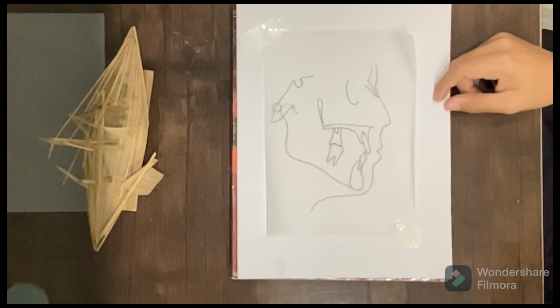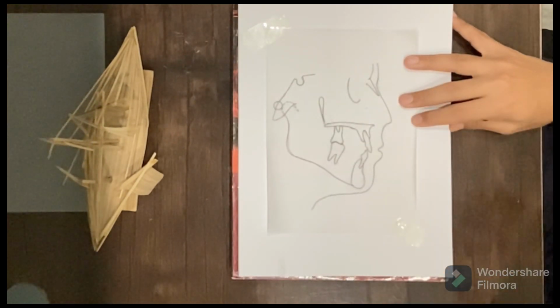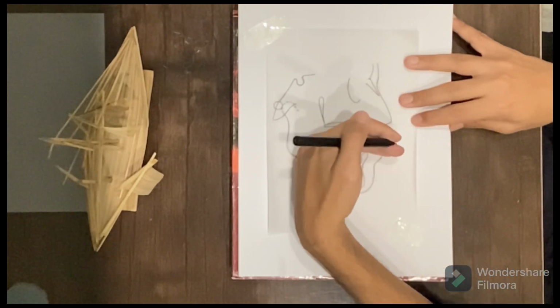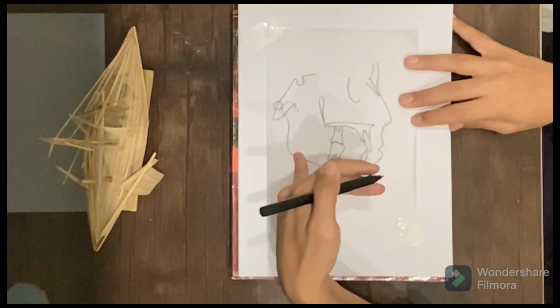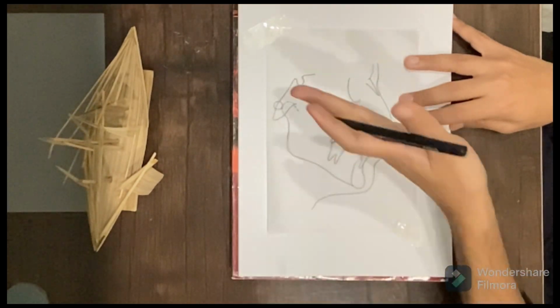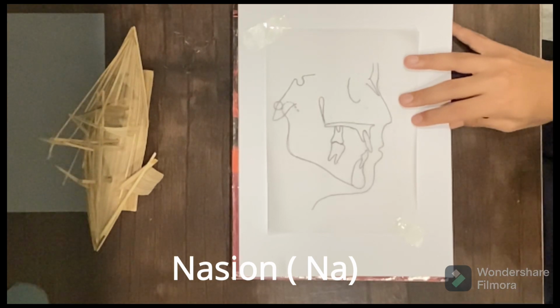Okay, and now about the basic landmarks. Shall we start now? Basically, they are divided into three parts: the cranium, the nasomaxillary complex, and the mandible. The cranium is further divided into unilateral landmarks and bilateral landmarks. First of all are the unilateral landmarks.